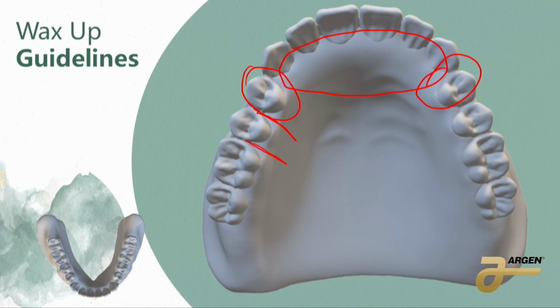Honestly, these premolars here, these first premolars, if they don't have enough room for their tongue, that's when they can start to say esh and not s. They can't say x, some of those things. So you might have to make more room for their tongue, either by moving those teeth out a little bit or carving the wax back there a little bit.